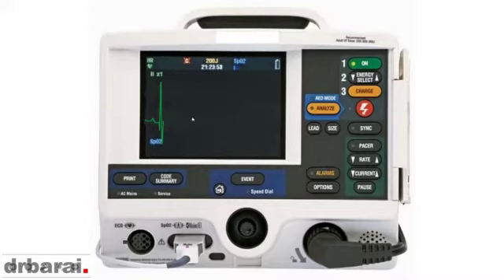What is the alarming feature here is this little wave. This is a Q wave. We call this dagger Q wave. If you do a 12-lead ECG, you will find that in various leads in the ECG, these dagger Q waves can be demonstrated, especially in the inferolateral leads. This is a classic presentation of hypertrophic obstructive cardiomyopathy. This can be a life-threatening emergency. They can have collapse, they can have VT, even sudden cardiac death. These patients need an urgent echocardiogram and also admission to cardiology for an AICD or the defibrillator implant.